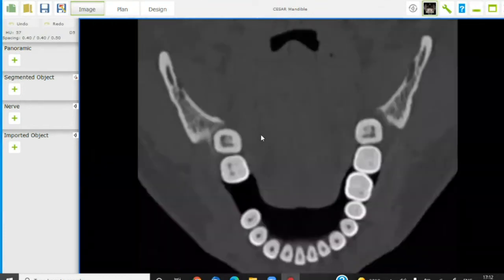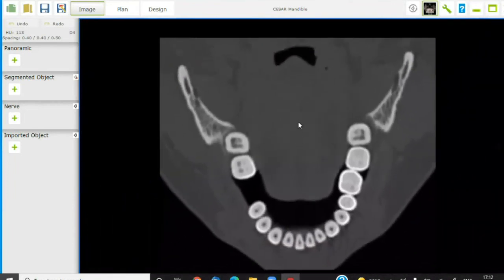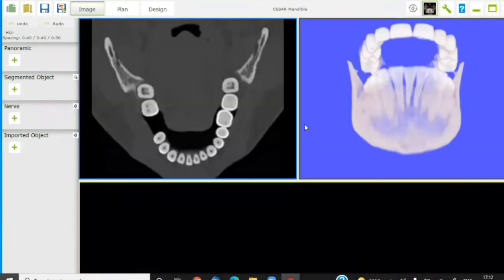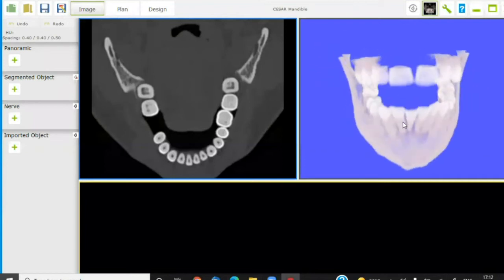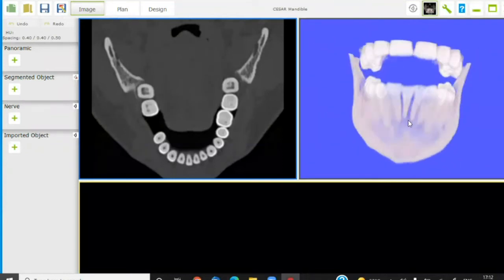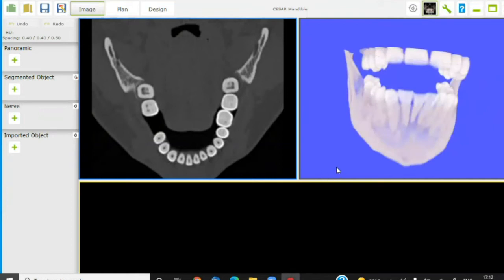Okay, and to zoom in and zoom out, you press and hold the scroller of the mouse and move forward and backward. And if you have to go back, you hit the space bar again to go back. Same way here also on the 3D image. Right click, hold, and then you can go around. Okay, so these are the simple things that we can see.